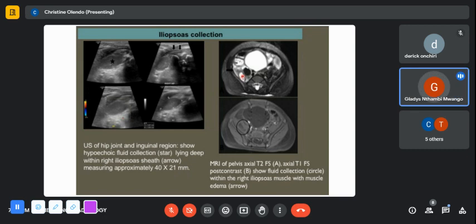Within the muscle, because I think what you are pointing to would have been a bowel loop. Yeah, sorry. And then you can see it on T1. Again, you can see T1 as well, it's hypointense, yeah, the fluid density. So there it is. And that's the collection, the psoas collection.